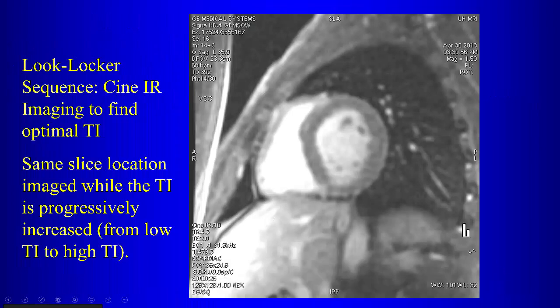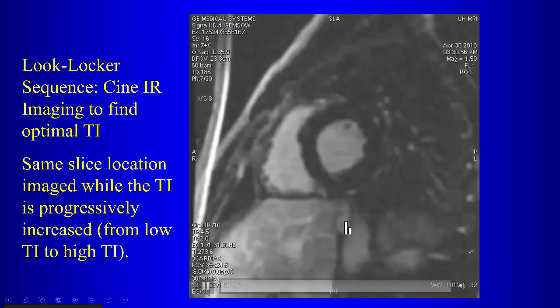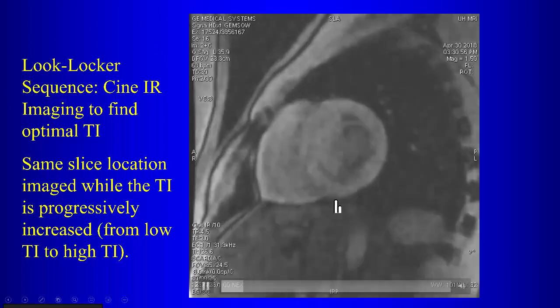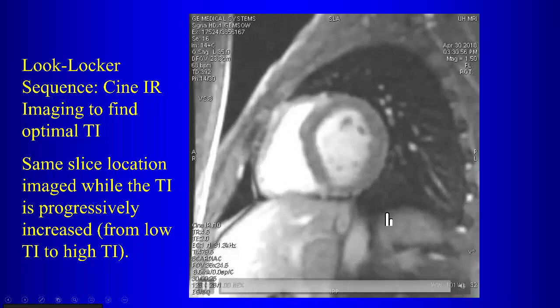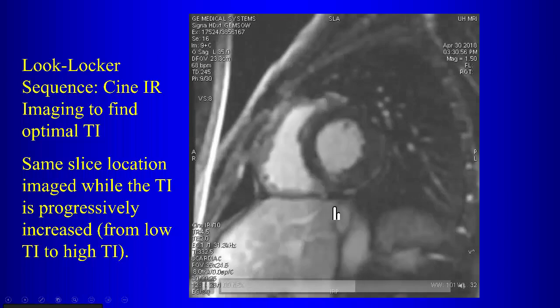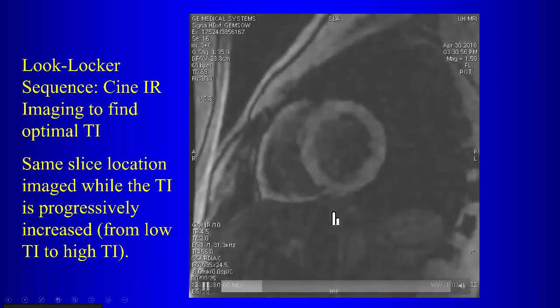And we will know that because the myocardium will turn dark. So as we go through this, we start with lower inversion times and go higher, and you can see how the myocardium at the lower inversion time starts out bright, and then it gets dark, so that's going to be your optimal inversion time, and then it starts to get brighter again, okay? So then that would be the inversion time that we would select to image the entire heart.